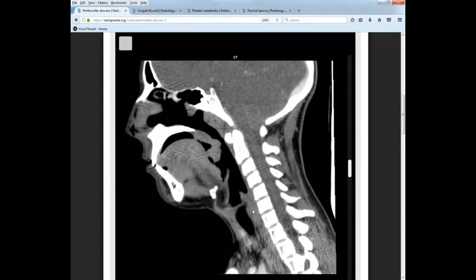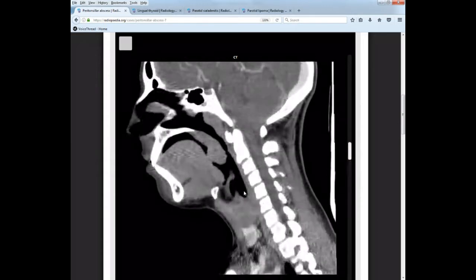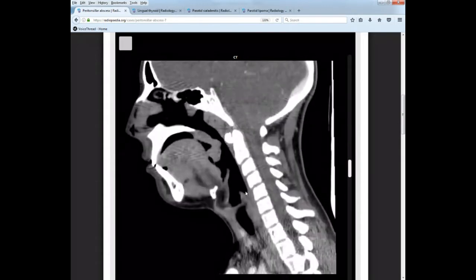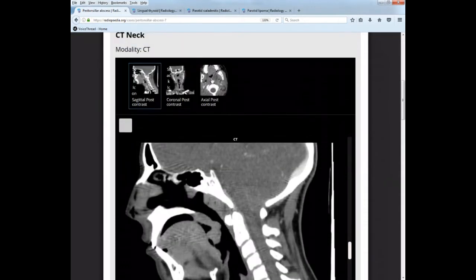Laryngopharynx. And this area includes the piriform sinuses, which, remember, those are two other posterior pouches or depressions that help divert food away from this area and down this area. So here's your piriform sinuses on both sides. Okay? So those are your three segments of your pharynx. Let's switch to a different view.